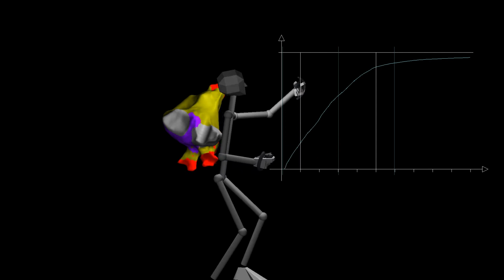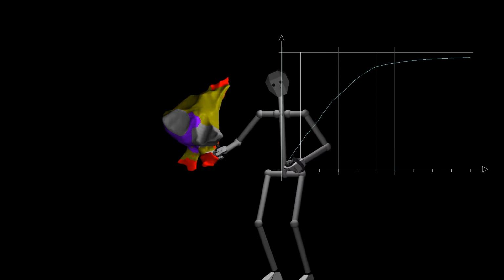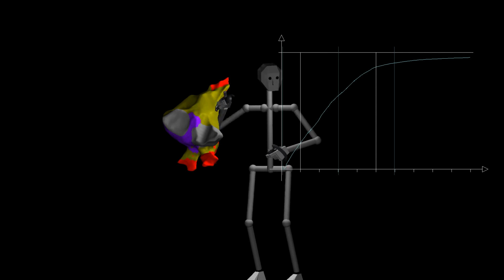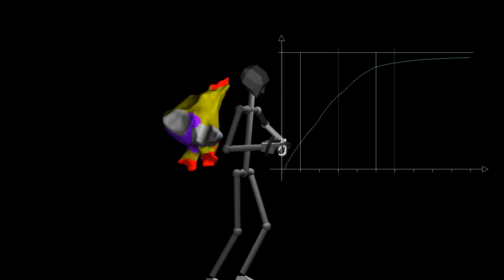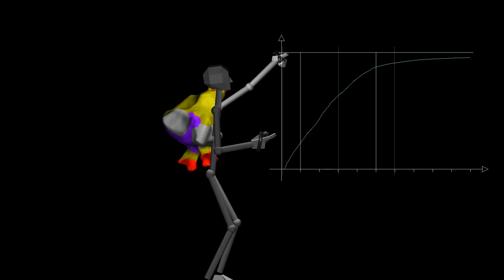These vertical lines indicate the 0.1 millivolt threshold, which corresponds to the border between red and yellow. And then over here, the 0.5 millivolt threshold, which corresponds to the border between yellow and purple, which are the important voltage thresholds that we were looking at. On the vertical axis, we have area fraction. So this goes from 0 to 1 or to 100%, however you prefer it.